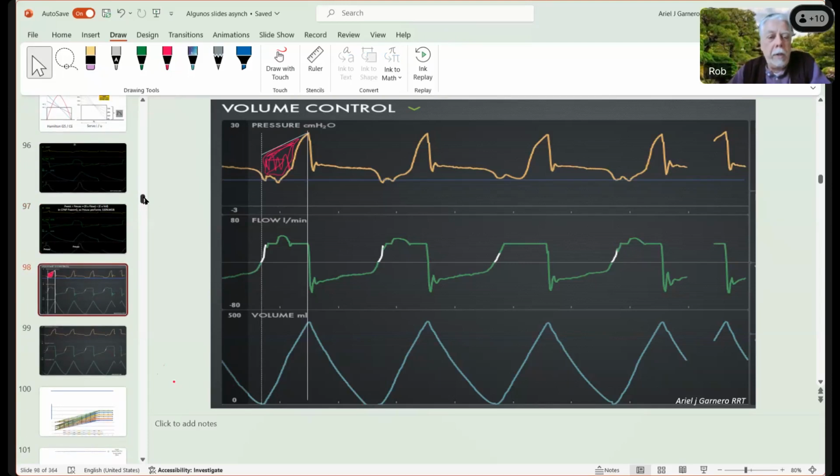I don't see any indication of PMUS during expiration except when the patient tries to trigger. And you see that triggering with the abrupt change in the direction of the flow curve. Or you want to put your little red line on that? During expiration, you mentioned, yeah, right? Yeah, during expiration when the patient makes the inspiratory effort. You had marked it before.